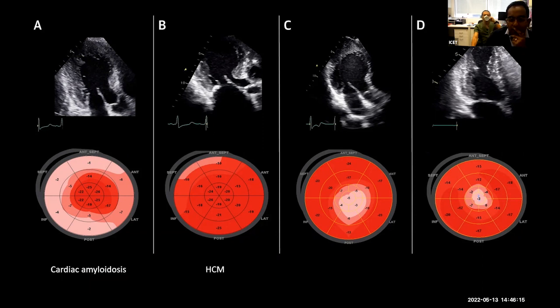Okay, yeah. So this is an example of hypertrophic cardiomyopathy where the strain is reduced, but it's a bit abnormal to get regional strain variations, because generally strain overall in HOCM is reduced. But that's why it becomes a bit more difficult in terms of just basing this on strain, because sometimes they could have LVH and amyloid as well as part of their picture.